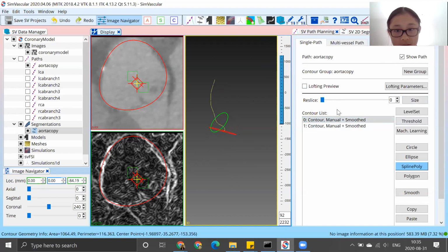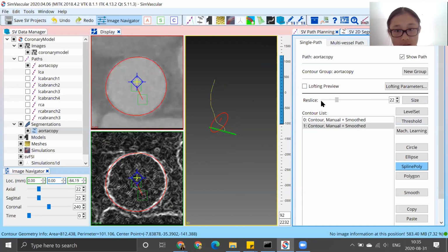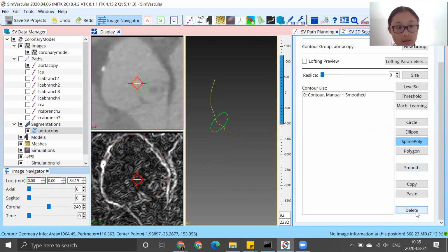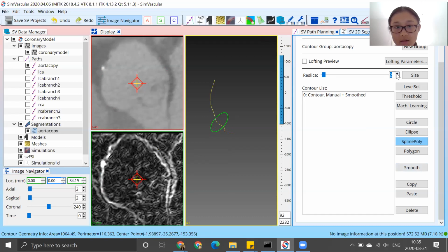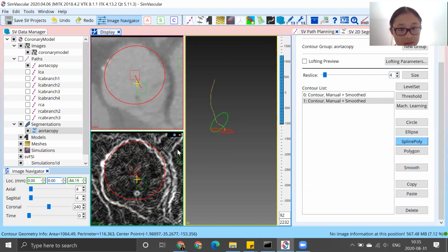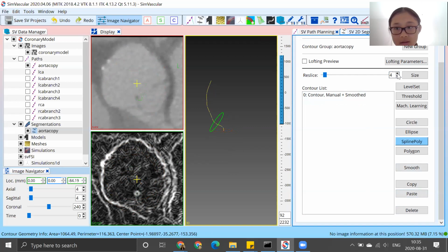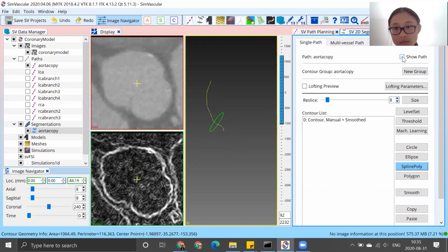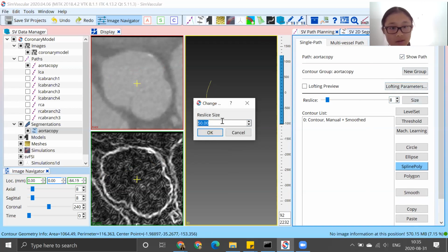It looks okay. Yeah, so we can delete this first one then, and scroll down, delete that first one, and then we can paste it. So you might want this to be a little bit bigger, but first let's move it so that it's at the right spot. So I think this is actually intersecting right now, so maybe I don't want to place it here. Let's just adjust the size of it to see if our reslice tool will reappear.